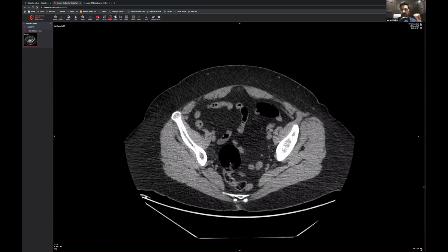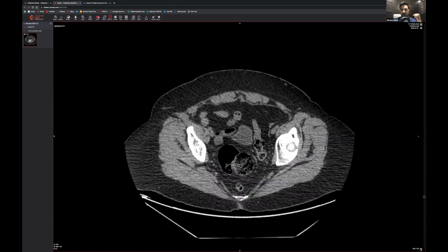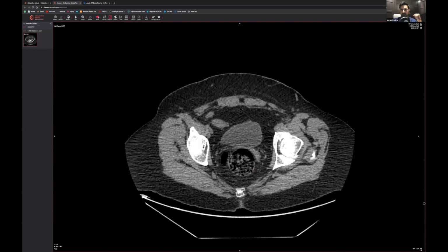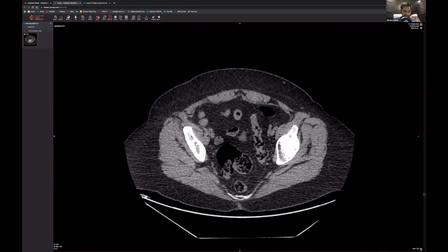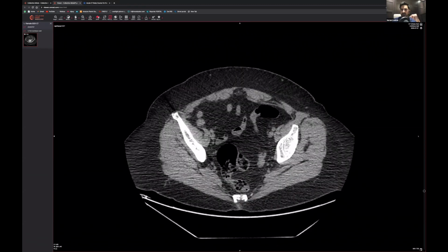Can't really quite see the ureter anymore. Very difficult to see, isn't it? Around there. But it must be this one coming this way. So therefore, okay, is that a stone? No, this is the ureter over here. Herniation. Yeah, perfect. Good. Okay, so fine.